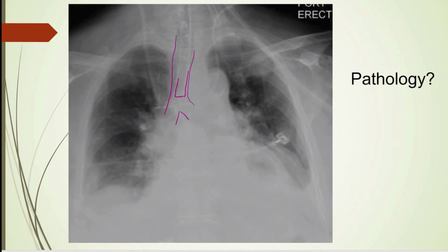This is one that I would definitely want a radiologist to overread, but for our purposes, we know the endotracheal tube is not right mainstem, although it does need to be pulled back a little bit. Looks like this is the right diaphragm. This left diaphragm, though, I just can't really see it. And I'm wondering if it's not elevated, and maybe this is a gastric bubble right there. So I think they've got something going on here in the left lung, and it looks like the volume in the lung is diminished as well.